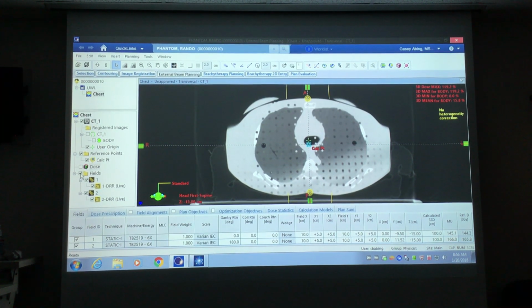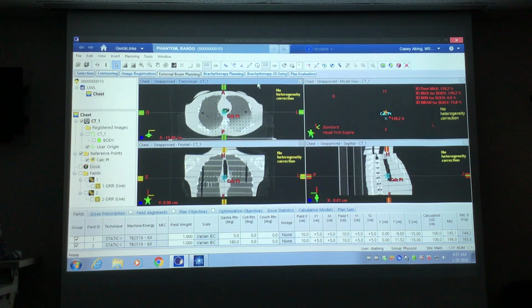This video is going to discuss the AP and PA, or parallel opposed field arrangement, and I'm going to use a homogeneous medium in the chest to describe the dosimetric characteristics and what we have to watch for with our dose calculations, or MU calculations. What you're looking at is the Eclipse treatment planning system.